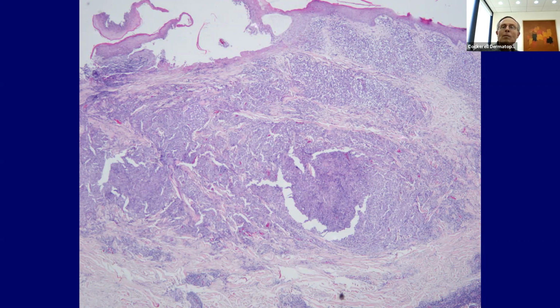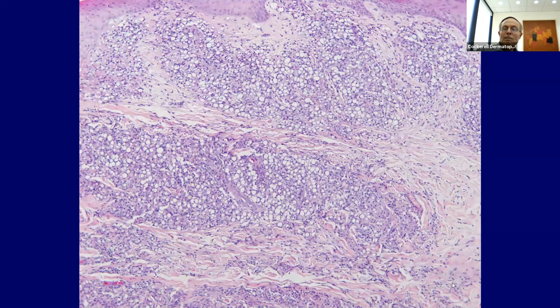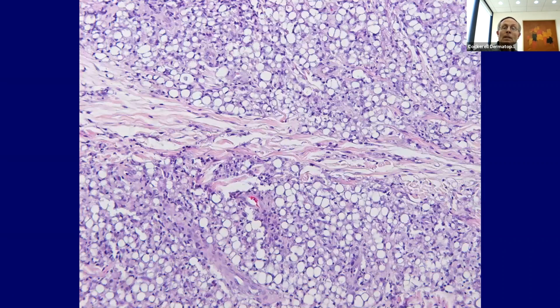And we go to higher magnification. We've got some lymphocytes in here, mostly histiocytes. And now we see these clear staining areas here. So that's helpful in this case. So again, maybe it's foreign body granulomatous dermatitis as opposed to suppurative. Okay, and here, at higher magnification, we see these clear staining areas with these histiocytes, maybe some plasma cells admixed in here. And let's go to the highest magnification.